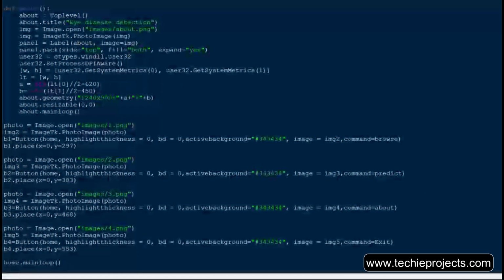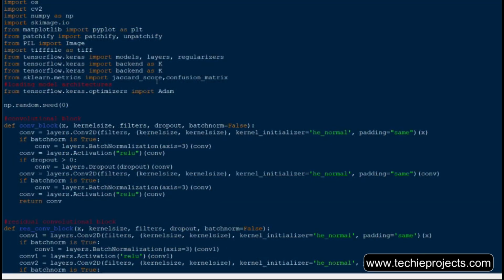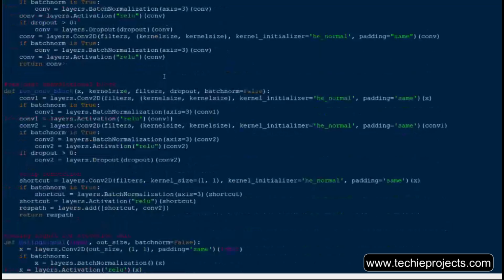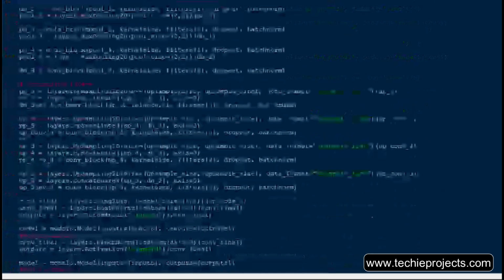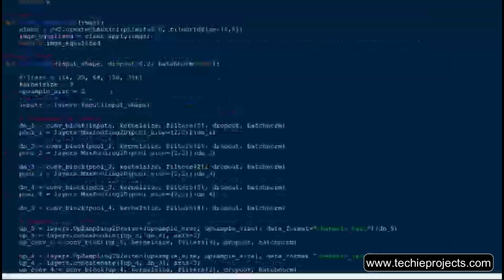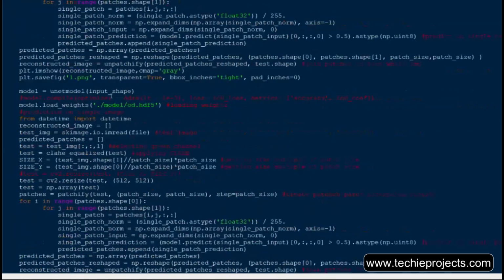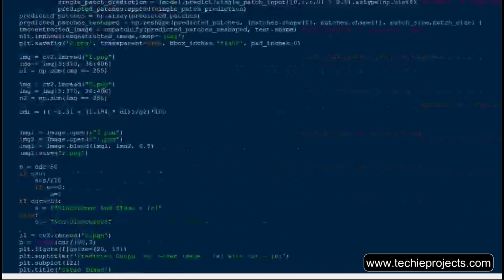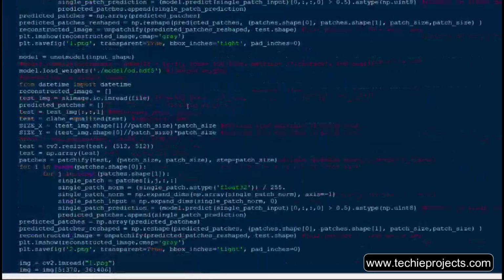What we are doing here is, earlier in the last meeting, we discussed segmenting the CDR, segmenting the optic cup and optic disc. So in this pred.py, I have just saved that model from our training file, and in this pred.py, I am just loading that saved model, and then applying my formula for calculating CDR to calculate the CDR value.